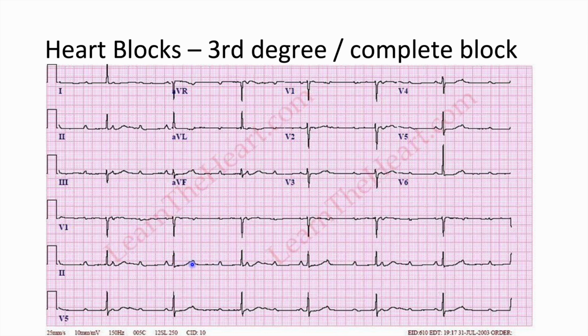And so that can also be tricky. Don't get confused that sometimes it'll overlap with another, like with a QRS complex or with a T wave. And so you might just think, well, these are spaced further apart. But no, you can actually kind of see, here's one, it's just under the T wave. Or if it's under the QRS complex, you might get confused and think it's something else like Wolff-Parkinson-White, but you need to look at the whole picture.